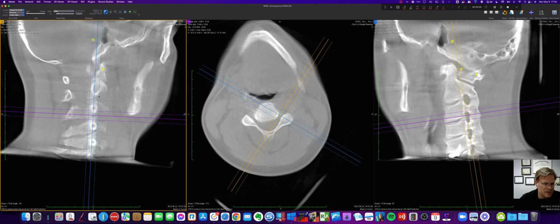These are not curved. He didn't have a good curve. It was fairly straight, maybe slightly kyphotic. But looking at these, you can see some differences as well that may give you a clue. That looks anterior to that. That looks posterior to that. So let's see, C2, C3, did C4 go posterior on C5? That might give us an idea.